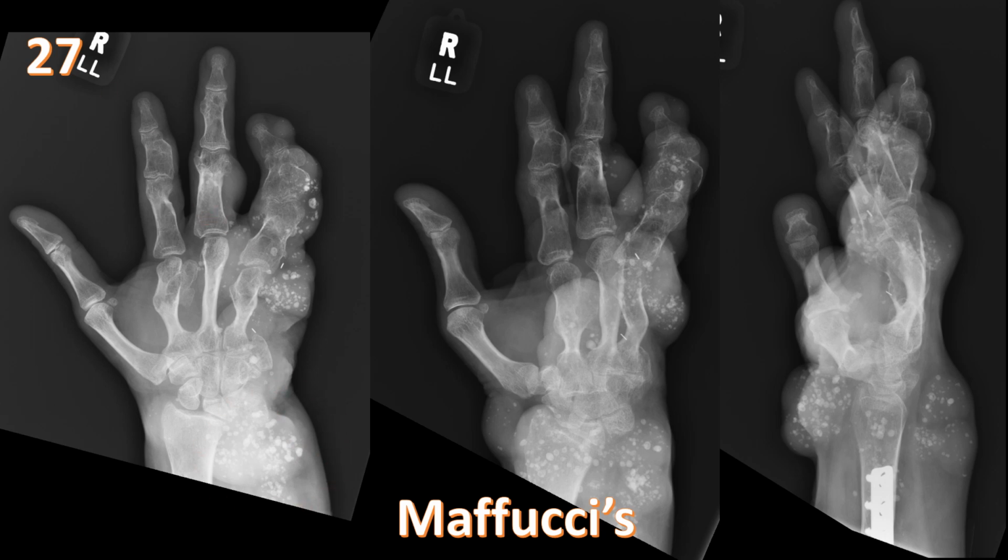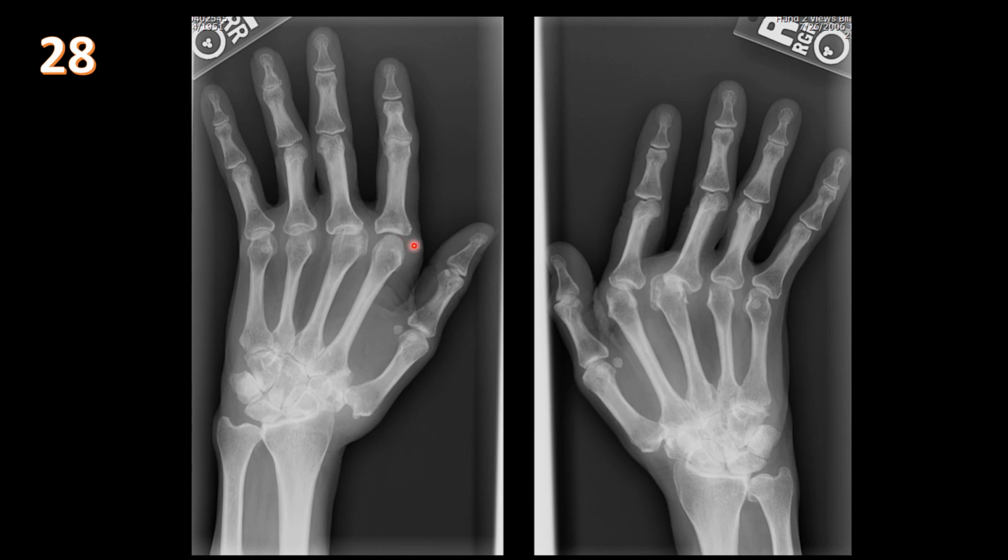to chondrosarcoma. In this case, we have two views of the hands in PA, and we see that there is ulnar deviation at the metacarpal bones bilaterally. However, we see that there are no erosions, no marginal, central, paracentral erosions, or any destructive changes of the bone.